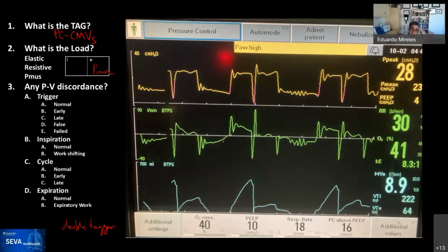When you look at the load, it's really challenging sometimes to see these things. During inspiration, this is a patient-triggered breath, and you have the big spike, then it goes down, then it goes up, and then it takes a while to go down. Then there's another breath trigger because it cycles, the flow drops rapidly, and then it goes really high up, dropping the pressure below the baseline, and then there are these oscillations, up and down, and then the breath ends. Then there's nothing, then some wobbling, and a little bit of what seems to be effort, and then another breath gets triggered with a bigger drop in the pressure, and then this long drop down.